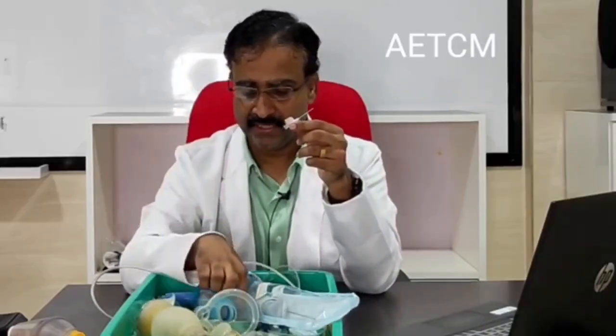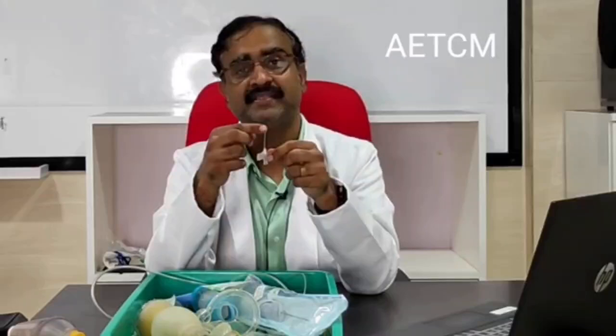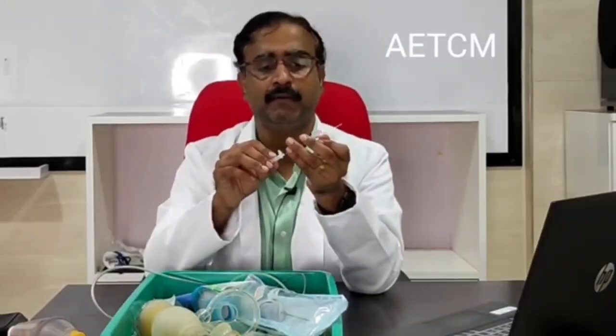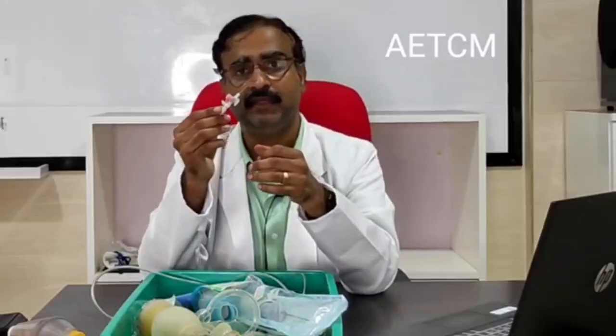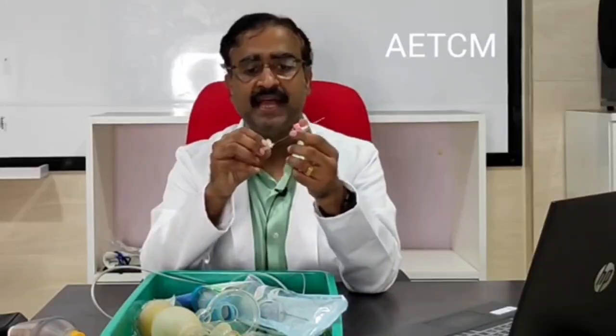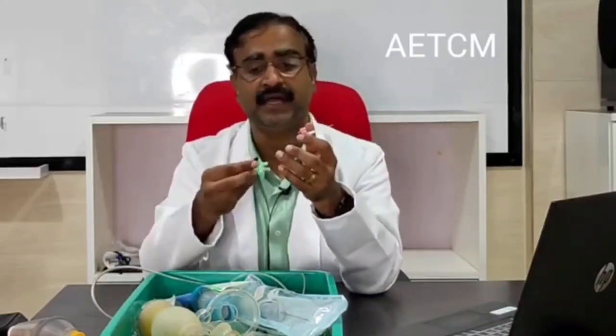Like I had mentioned, the scalp vein set has a metallic needle as compared to the plastic sheath that the IV cannula has. Now, how else can we improve the function of an IV cannula? Once the IV cannula is secure inside the vein, we could attach something called a three-way set or a three-way stopcock.